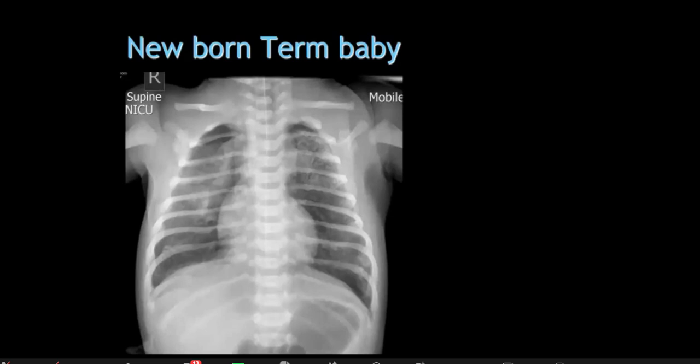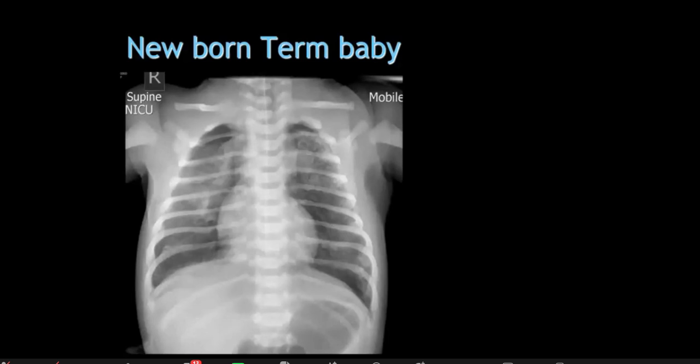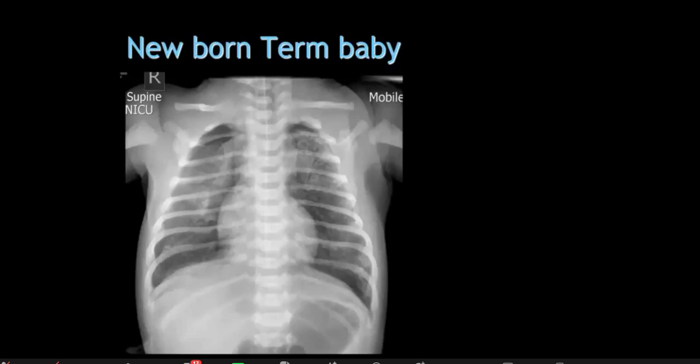This is a frontal chest radiograph of what I'm told is a term neonate. There is an appropriately sited nasogastric tube in situ. The lungs bilaterally demonstrate ill-defined, peripherally predominant opacities. And then biapically there's increased translucency, potentially consistent with small pneumothoraces.